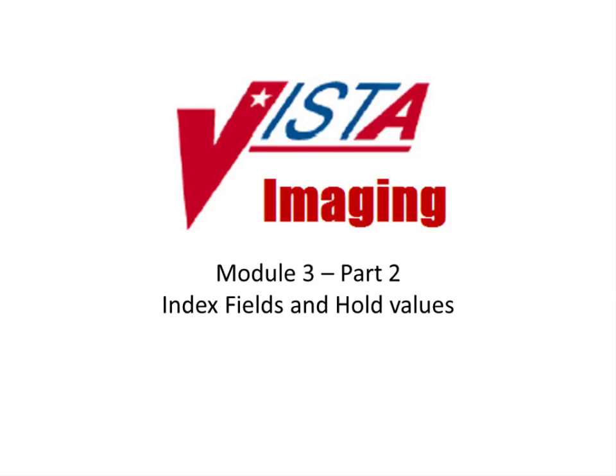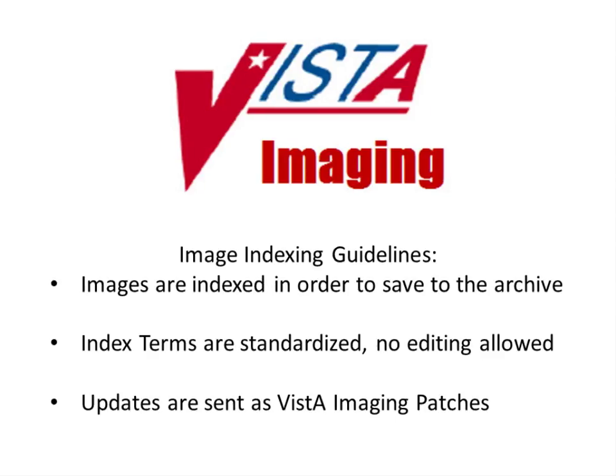This is part 2 of Module 3 in the series of Vista Imaging Clinical Capture training modules, and it will cover index fields and hold values. It is suggested that the modules initially be viewed in sequential order to become familiar with the options necessary to perform document scanning and image captures. Before I demonstrate how the index fields are used, let me explain some image indexing guidelines.